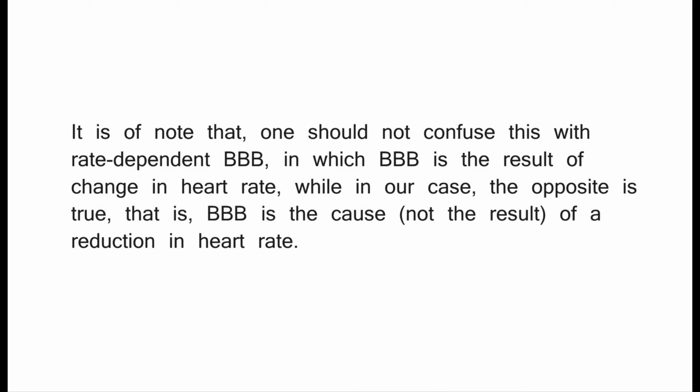It is of note that one should not confuse this with rate-dependent BBB, in which BBB is the result of change in heart rate, while in our case, the opposite is true, that is, BBB is the cause, not the result, of a reduction in heart rate.